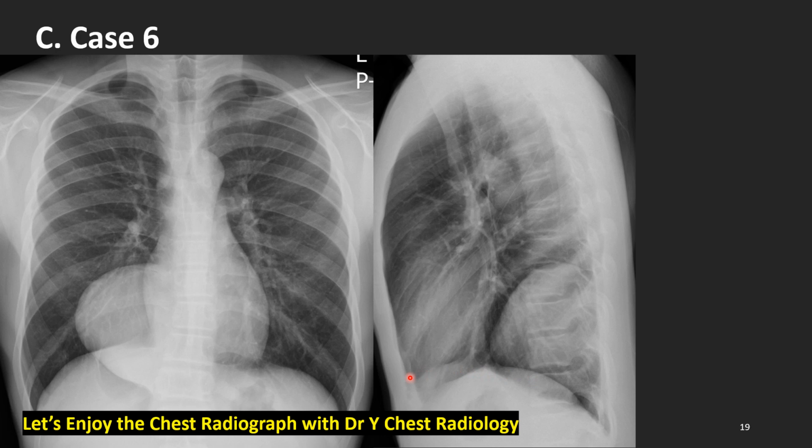The diaphragm on the frontal radiograph is actually the continuation of the highest point of the diaphragm here. This line is the highest point of the diaphragm, not all of the diaphragm. So the diaphragm is actually here and here. The mass above the diaphragm line should be only in the thorax, but the mass below the diaphragm line also can be in the posterior thorax too.